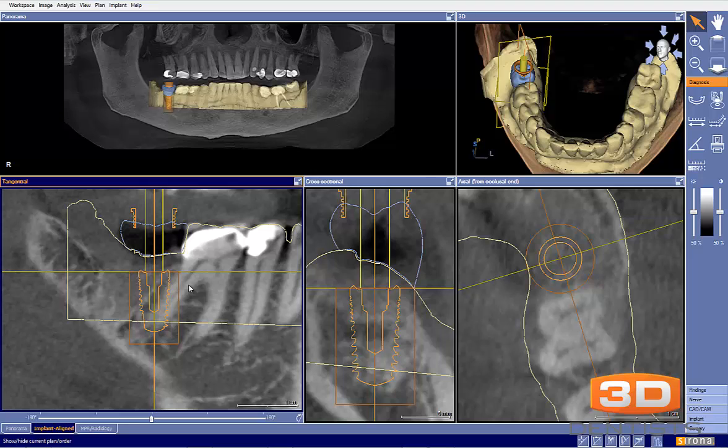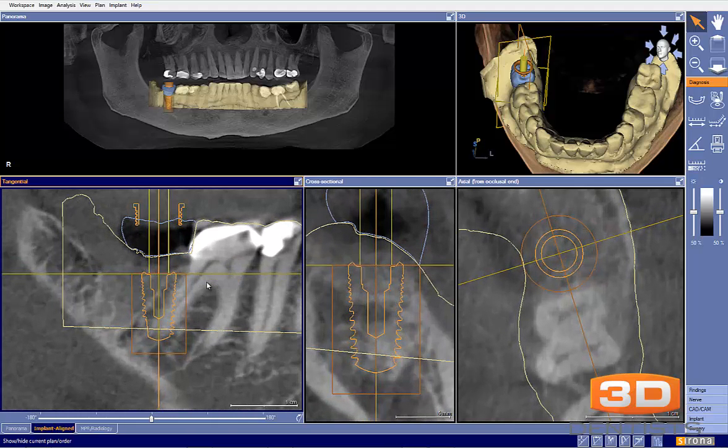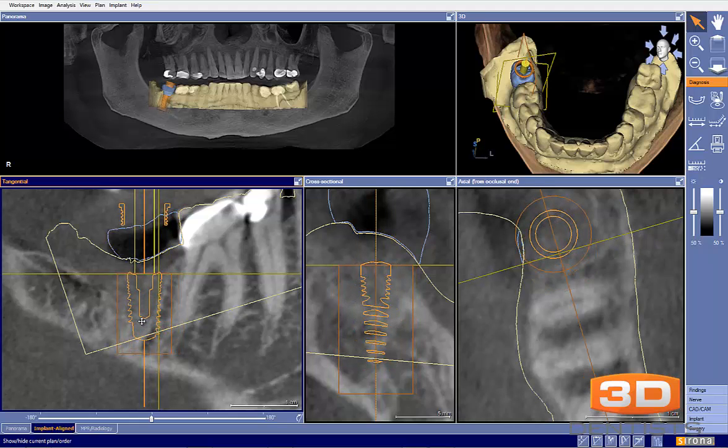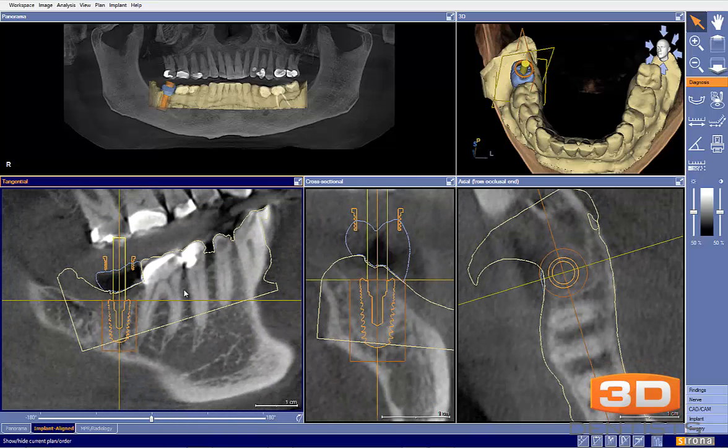That root is quite diverged, and those of us that have taken these teeth out in the past know that these teeth have a tendency to snap right there. So that root is quite diverged, and if we put our implant right there where it's quote unquote supposed to be, we know that we're going to end up with a massive problem. So in an effort to go against that, we will certainly move our implant the requisite 1.5 to 2 millimeters away, and now that leads to our occlusal plane issue.